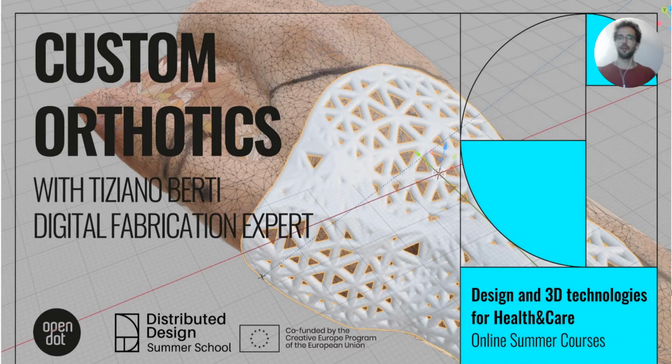Hello everybody, this is the second part of the first tutorial, which is how to use Visual SFM in order to get a proper scan of the human body, in this case my face. It's a follow-up of the Visual SFM tutorial, because Visual SFM is a nice software that can run on Mac operating system, and it's actually the only one I found that runs on Mac operating system. So if you have a Mac, you're stuck with that.